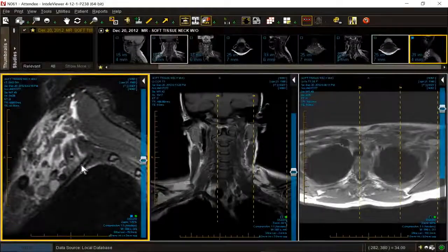In the venous form of thoracic outlet syndrome, there are both bone and soft tissue abnormalities, not infrequently. Collaterals are common, and this patient has so many collaterals, it's hard to articulate where they're coming from. Look at all of these flow voids here. I don't know what to name them, but they are flow voids. There's also eventually narrowing of the venous complex. If this goes on for a while, the veins will collapse, they'll scar, and then you're in real trouble and you have to go to some type of venous grafting.